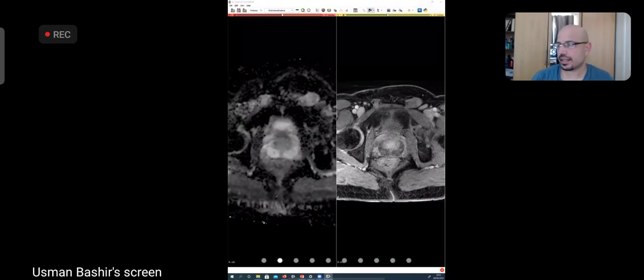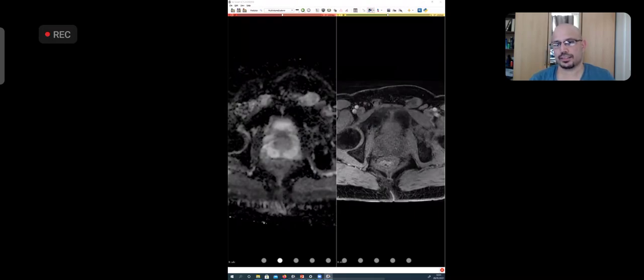So I think what I want to especially emphasize in this DCE series, let's start again. So I'm going to go fast. I'm just going to put it on a cine loop. Let's watch it. You see how the transitional zone is lighting up? See how this is your reference.